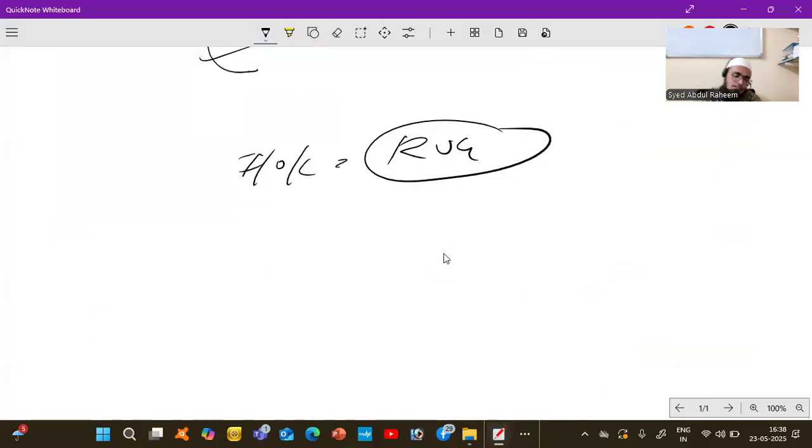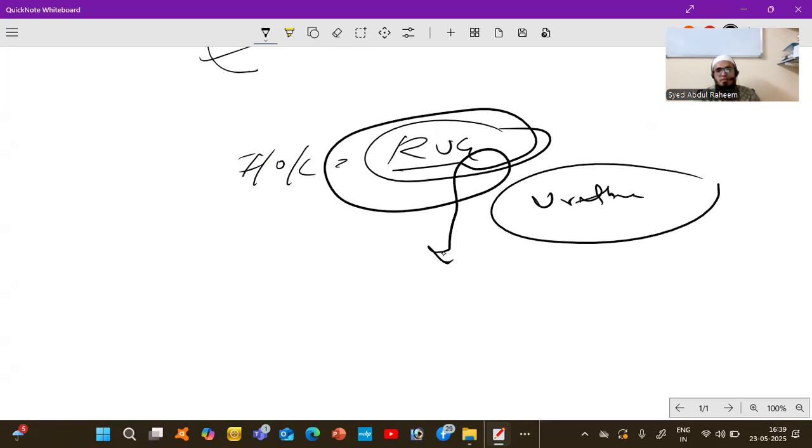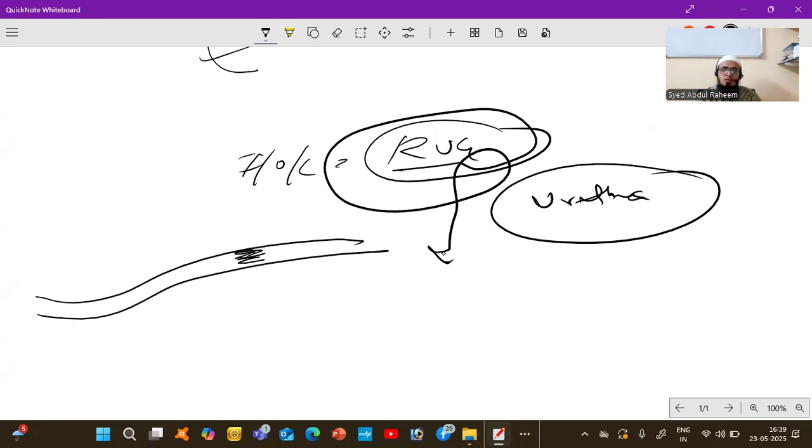Next, what is the investigation of choice? Already I told you, RUG, retrograde urethrography. It will give you the information of the complete urethra, the structural problem. Here there is a blockage. The blockage may be fully developed, so it cannot be passed, so we need to cut this down.